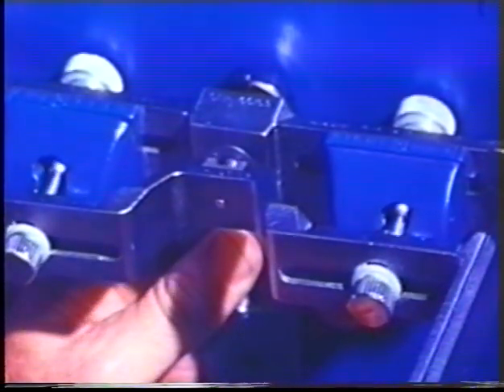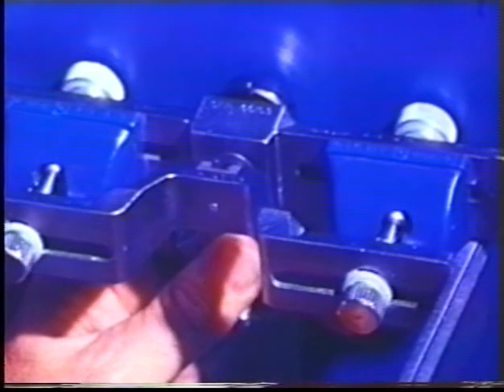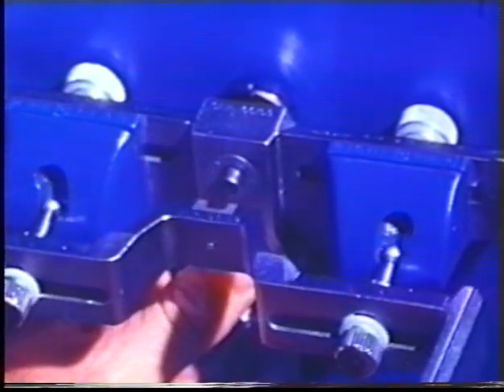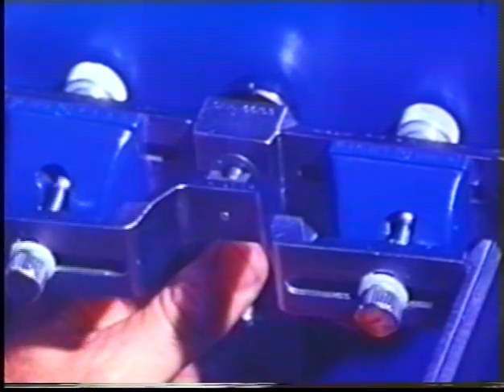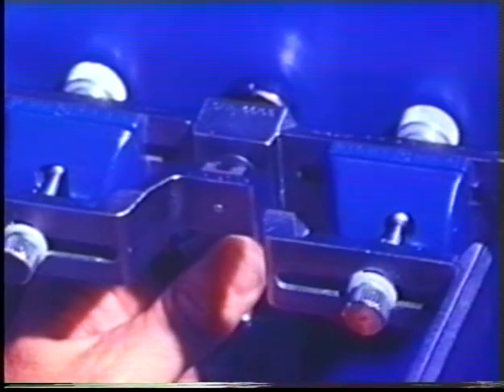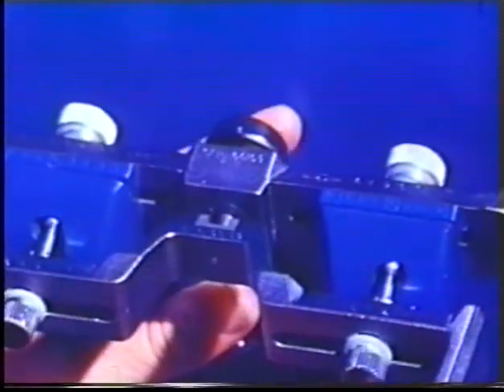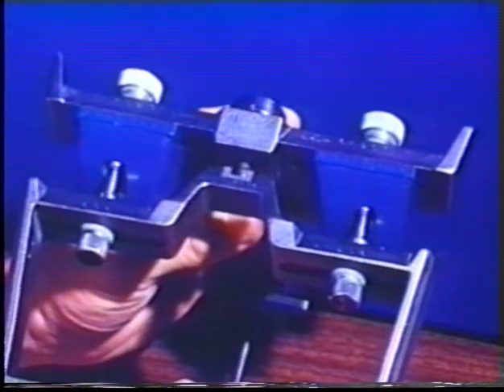Outward and inward Bennett shift, inward on the Bennett, and orbiting paths. In the right working path, the balancing Bennett and orbiting paths, and back to centric. The centric pin is depressed to position the condylar elements in centric relation.